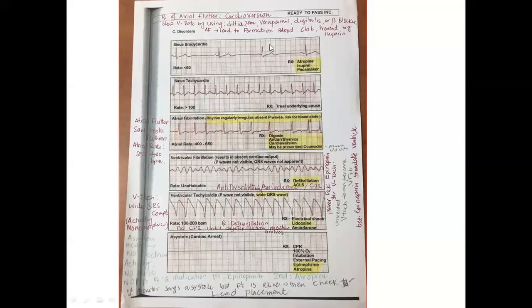heartbeat? Again, same formula. This is the complex, another complex. QRS, another complex. So how many boxes in between two complexes? This is one box and this is two boxes, right? Let me write it here. As I told you, this is the P wave here, another P wave here. This is the P wave.